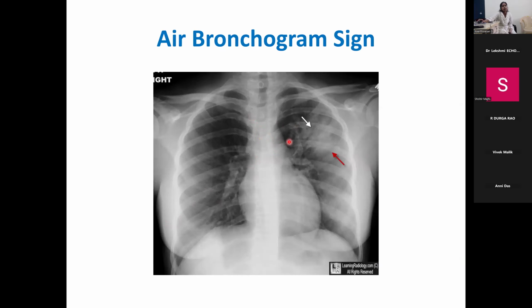And next I'm giving you some chest X-rays where you may confuse it with X-rays of TB. So this is a consolidation. Why do you say this is a consolidation? Can you see the air bronchogram here? Okay, can you see these black lines? And this is the dense opacity, which is appearing white. So this is nothing but a left upper zone and middle zone consolidation.